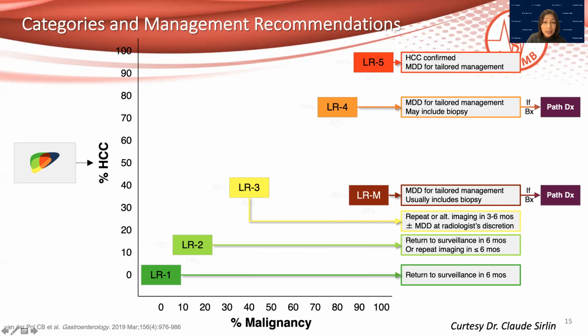LIRADS M will be biopsied, as we discussed. LIRADS 1 or 2, on the other hand, is not likely an HCC or malignant, so we can go back to surveillance. So it helps stratify the management.